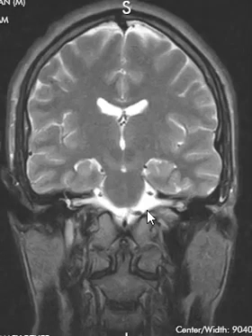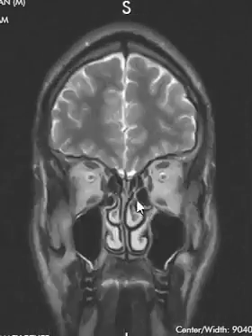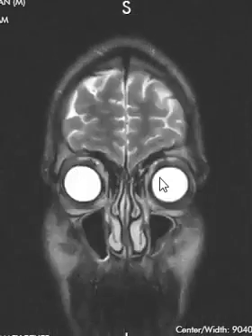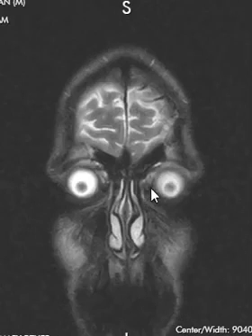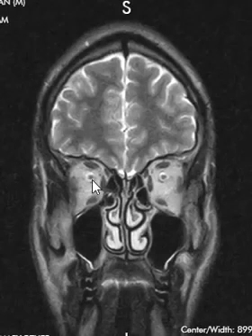This is another orientation where we're looking straight at the patient. If we go very far forward, we'll see the eyes. Here's the right eye, left eye. We can see the lenses there in the very front. This is the nose area, sinuses. And with the eye, we can see the optic nerve coming off the back on the right. Here's the optic nerve there.